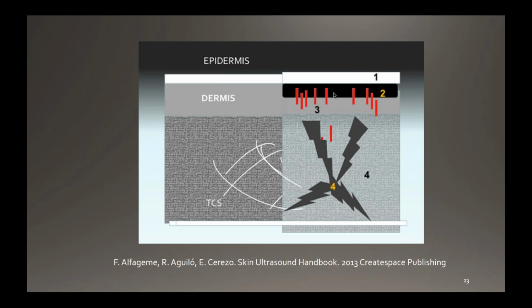Then it's a work of education of the patient that also can be done by the dermatologist or by you as radiologist. When the skin becomes inflamed, these areas tend to be more vascularized. We have more Doppler signals, and the echogenicity starts to be decreased. If you remember the wonderful webinar by Dr. Catalano, you should always identify these layers of the skin, the epidermis, the dermis, and subcutaneous tissue, that in the case of inflammation, it starts to be less echogenic, more hypoechoic, mainly in the upper dermis because of the superficial plexus that is located in this area.